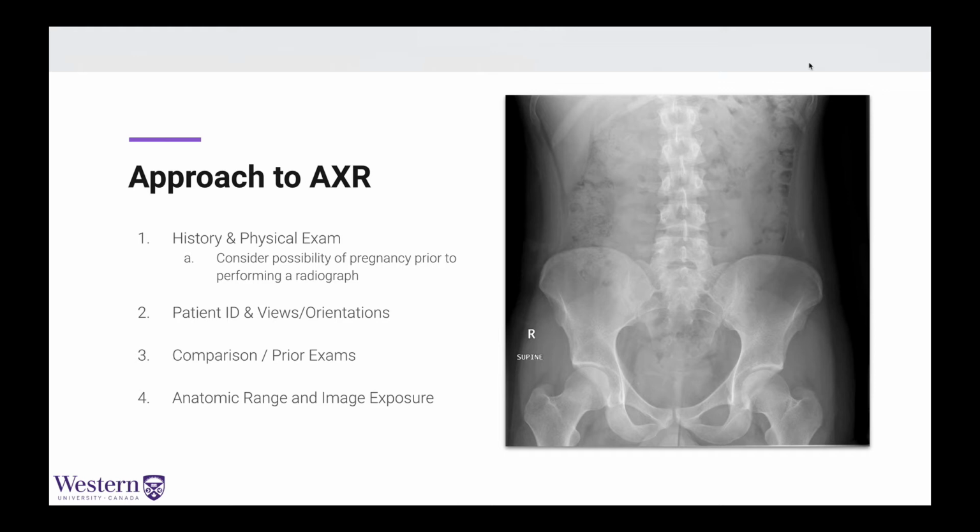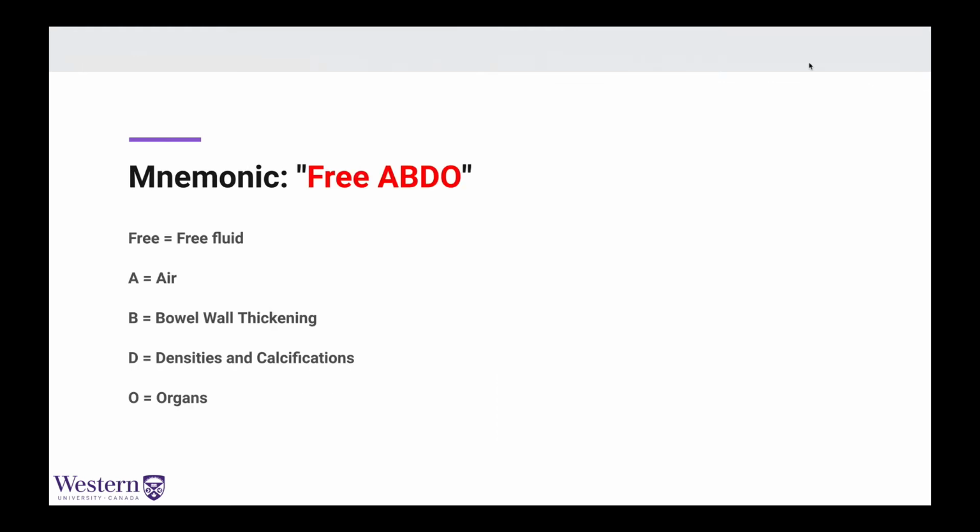And with respect to image exposure, how you evaluate that is that really you look for that soft tissue contrast, particularly over the psoas musculature, and being able to see that the x-rays have actually penetrated all the way through to be able to see enough detail within the vertebrae and also the adjacent muscles that are present there in the retroperitoneum.